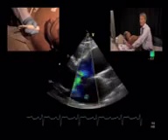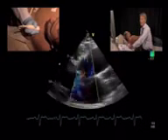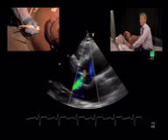Now, if we look at the area of the jet, we would probably underestimate the severity simply because it is asymmetric and because there probably is so-called Coanda effect, or we're losing a lot of energy since the jet is directed into the anterior leaflet of the mitral valve.